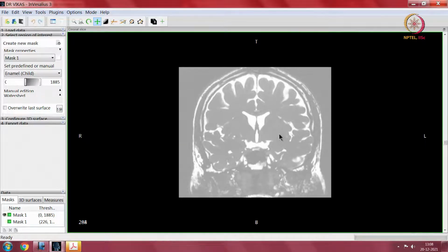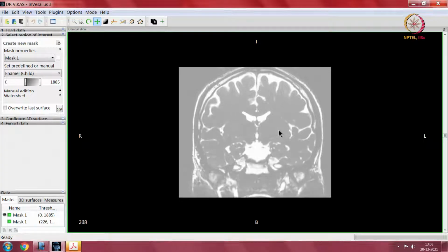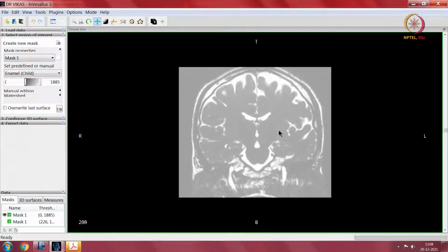This is a bad section to comment upon the motor cortex and things like that, because you can hardly make out anything. This is the corpus callosum. Corpus callosum formally is only so much. These 2 bulges which are seen over here, separating the lateral ventricle and the third ventricle, is the fornix.